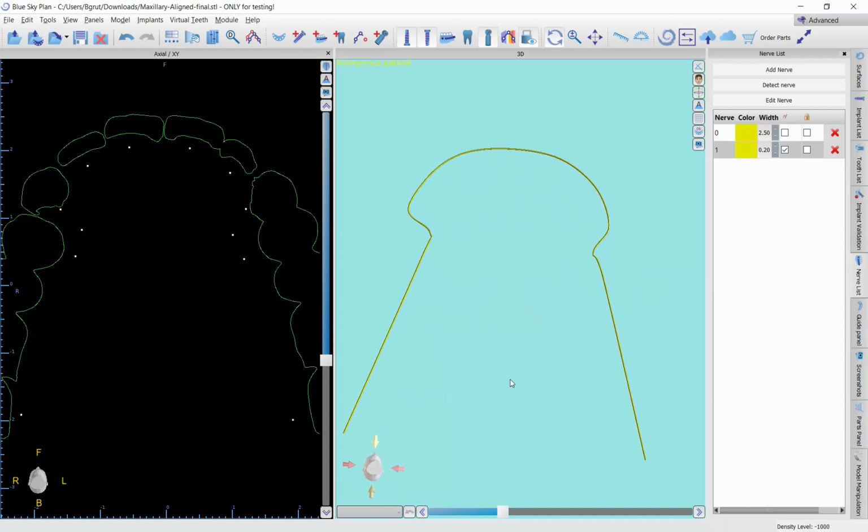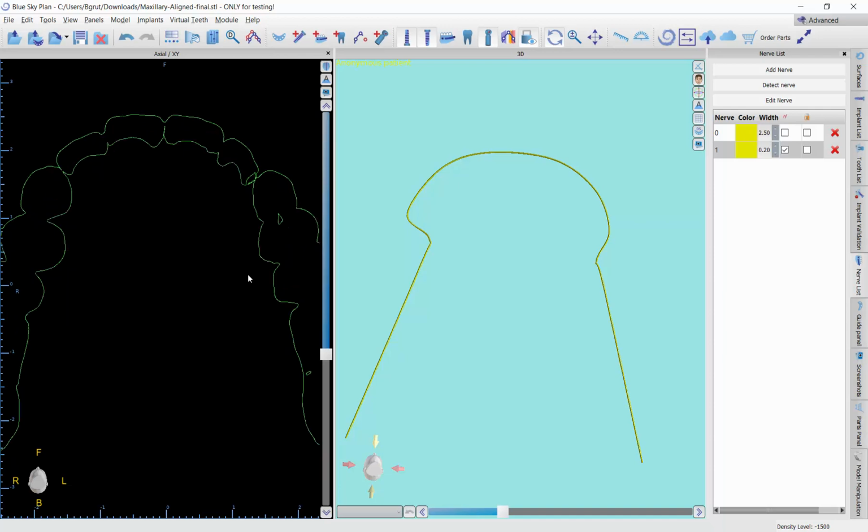And lingual wires, again, I'm not real familiar with them. I don't use them. Anyway, I hope that is another point of interest.